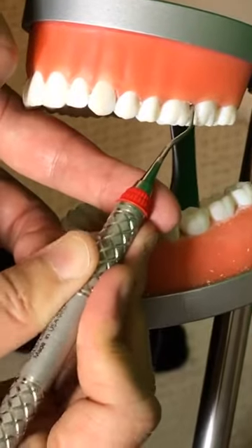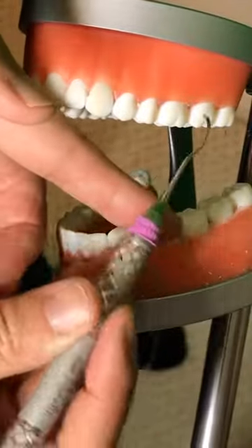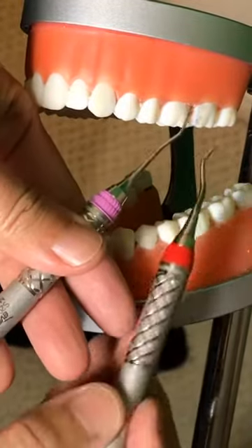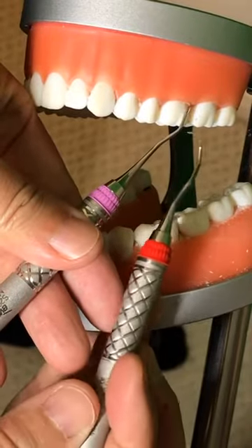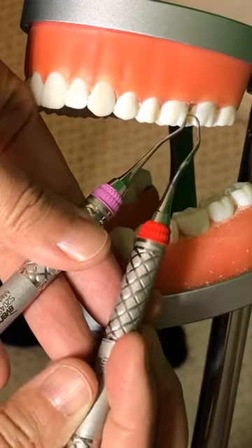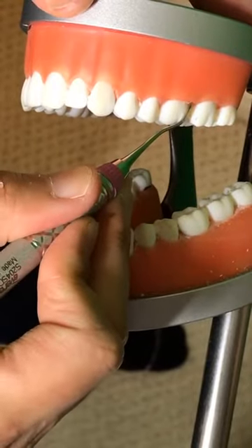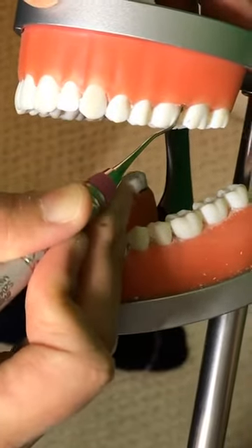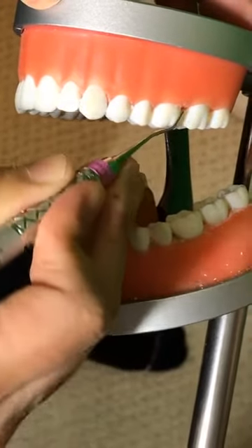Then the sickle. The sickle would be a very similar way. If you look at it, this first bend could be pointing to the distal side. That's okay. But because this sickle is at a 90-degree angle to the terminal shank, you have to close this terminal shank slightly right here to create your own 70-degree angle. This one is not as sharp, so I had better sharpen it.